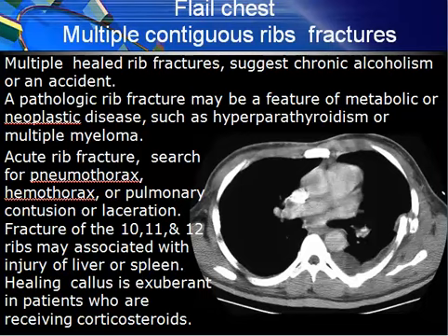Another case of multiple contiguous fractures. Multiple healed fractures suggest chronic alcoholism or an accident. Those with multiple fractures, here is one, here is two, are usually chronic alcoholics or it is due to an accident.